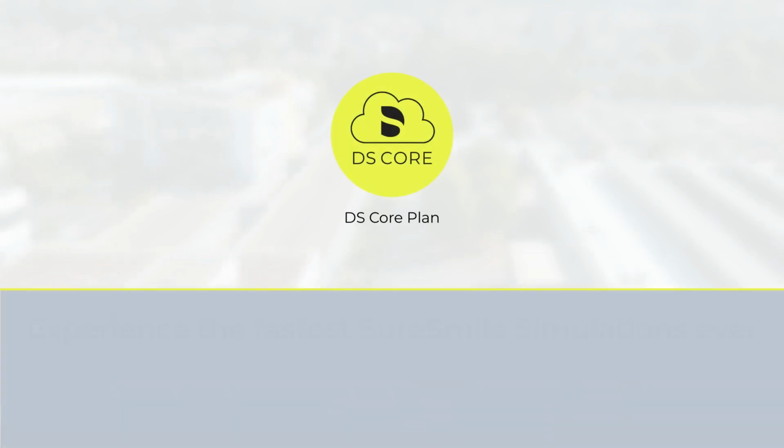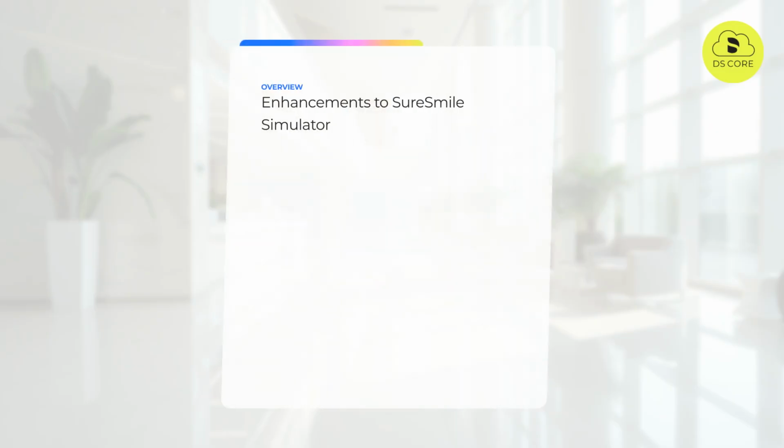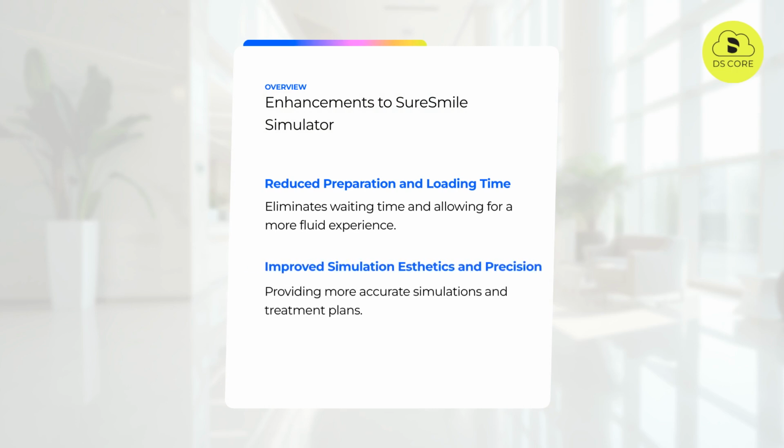In this tutorial, you'll learn how to save time and get quicker from scanning to a simulated treatment result that engages your patients during your aligner consultation. We've significantly reduced the preparation and loading time of treatment scans for orthodontic treatments and enhanced the simulation aesthetics and indication precision.